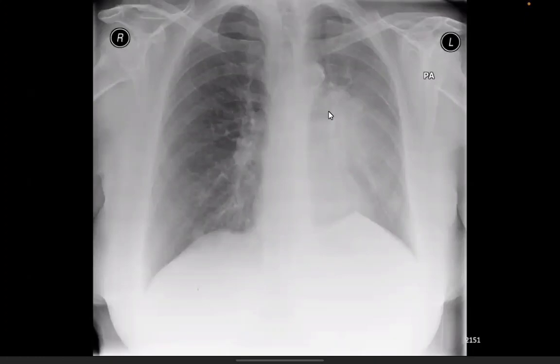Likely cause for this is going to be an endobronchial carcinoma. And while you're describing it, you should always look at the rest of the film, looking for bone destruction or contralateral changes. A straightforward left upper lobe collapse due to an endobronchial tumor, possibly with a hilar mass lesion. Although the detection of a hilar mass lesion is somewhat fraught with difficulty when you've got so much collapse. So it doesn't always hold that there's a mass lesion.